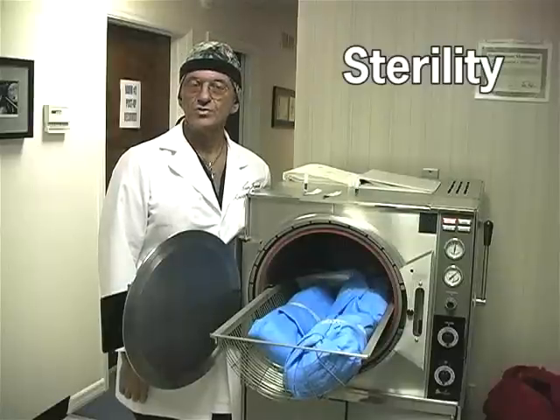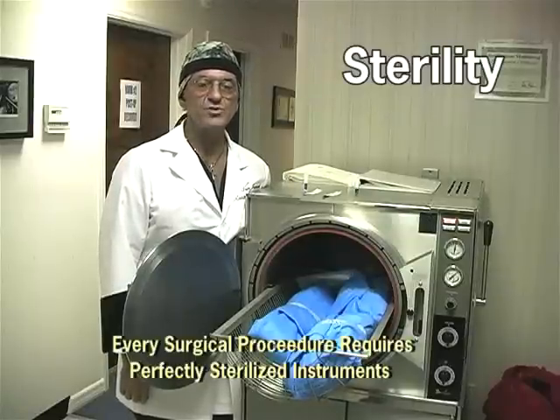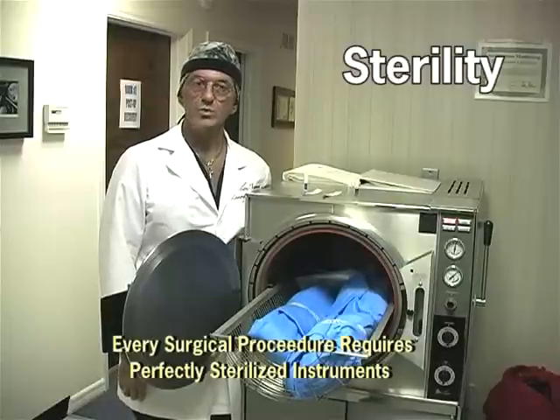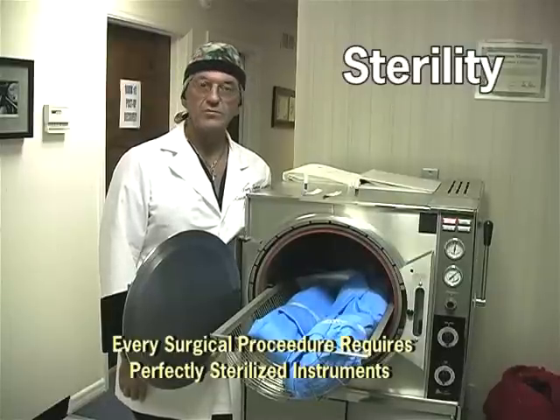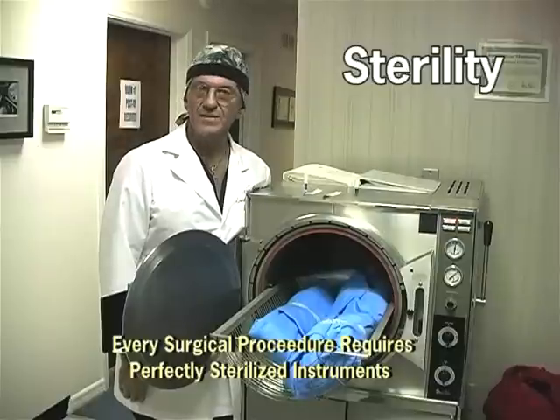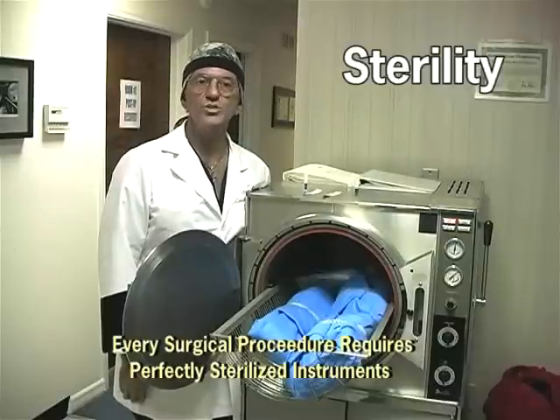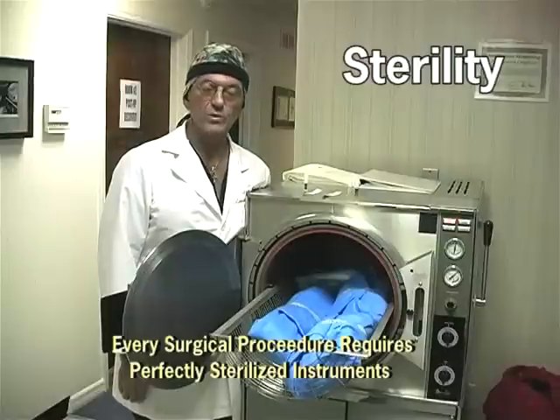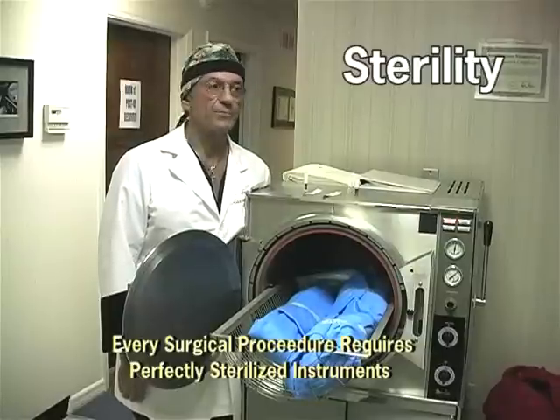A short word about sterility. Every single operative procedure requires completely, perfectly sterile instruments. We achieve that by the use of this autoclave. It treats the instruments at high temperature and high pressure to achieve that perfect sterilization. My assistant, Joy, will explain in a little bit more detail.